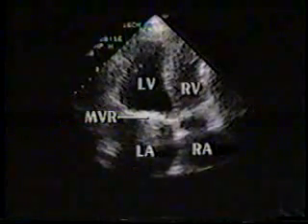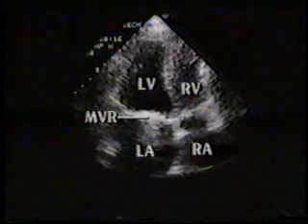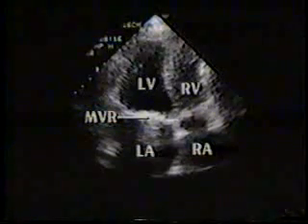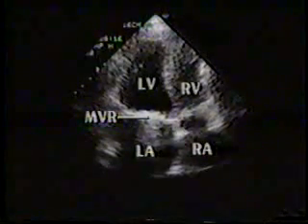This patient presented to us 4 months after implantation of Omniscience mitral and aortic prostheses. The Omniscience valve is another type of tilting disc prosthesis. This patient had developed orthopnea, and her chest x-ray showed pulmonary edema. Her aortic prosthesis had normal hemodynamics by Doppler.